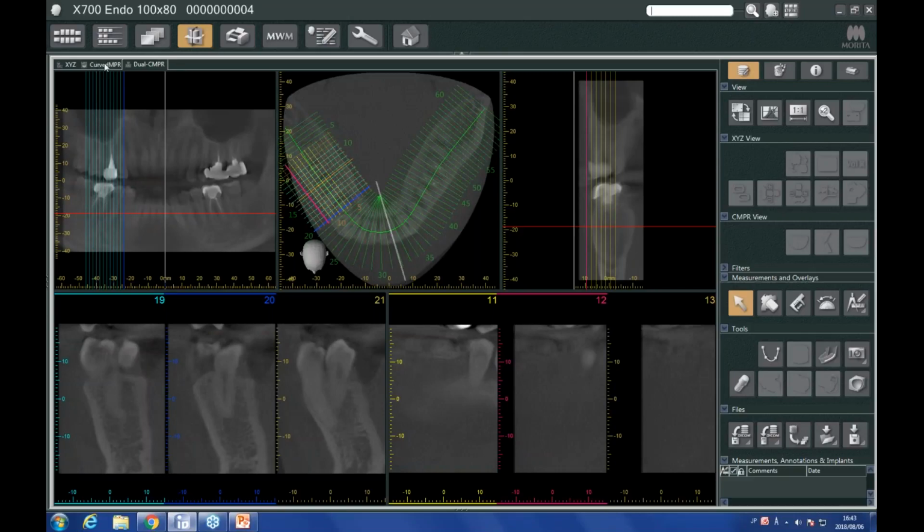So in this way, I can quickly build very professional looking reports without a lot of additional extra work. The work comes in actually designing my template to match my corporate aesthetics and to really show off the image quality and the images that my clinic is able to produce.